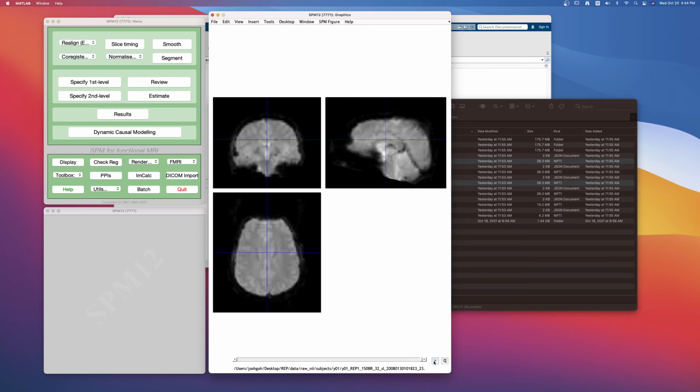If I start it again, you'll realize that the subject has rotated his or her head upwards, right? Tilted the nose up over time. And so this is one dimension of the head motion. This is the rotation, I believe, around the x-axis, all right? So that the subject kind of moves the head up. I'm going to play it again in case you didn't see it.